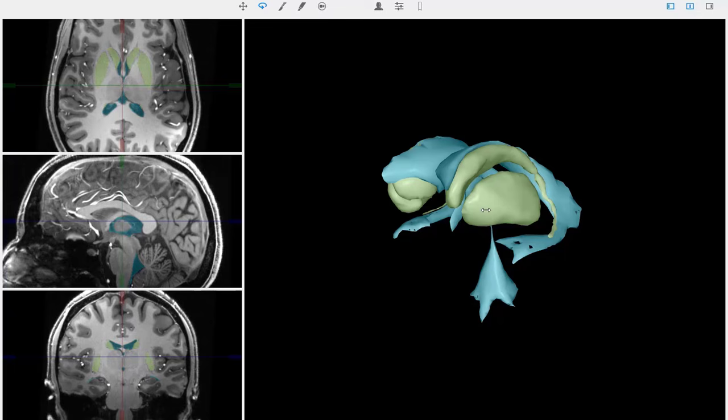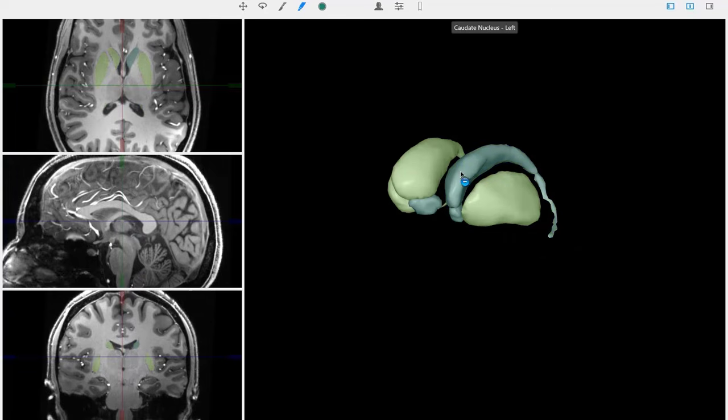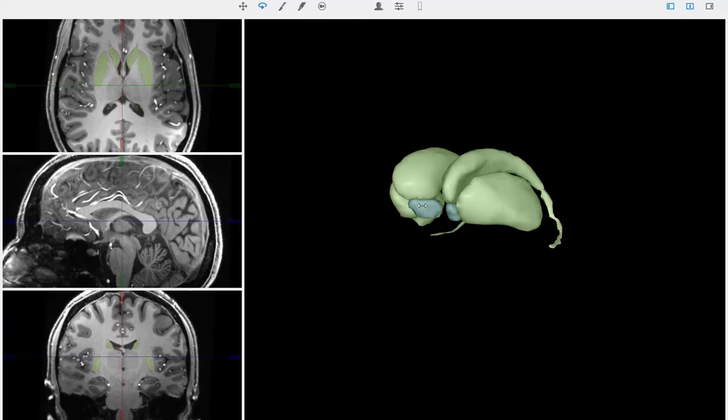And actually the striatum is still connected in one spot. That spot is called the nucleus accumbens, and it's the connection here of the caudate to the putamen. It forms its own nucleus, and it's an important location for the dopamine in the reward system. This is an area that's highly studied in research surrounding addiction. But please note that the nucleus accumbens is not considered part of the basal ganglia. It's part of the reward circuitry, but it anatomically is a place where the caudate and the putamen join.